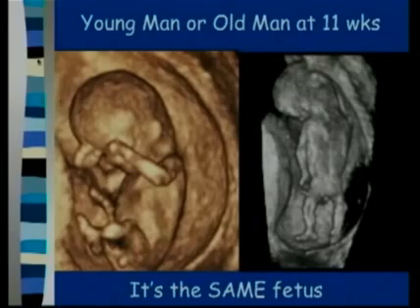I think the fetus in A looks like a conventional little fetus, you know, in fetal position, his little hands up here, little feet here. But in fetus B, in the picture in B, I think it looks like an old man that looks like he's trying to take a leak and go to the bathroom.